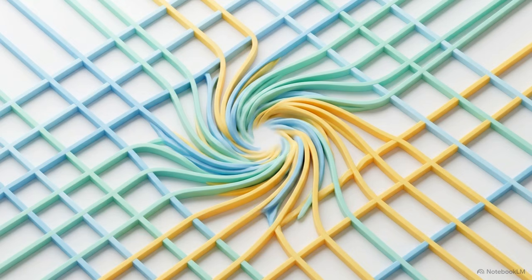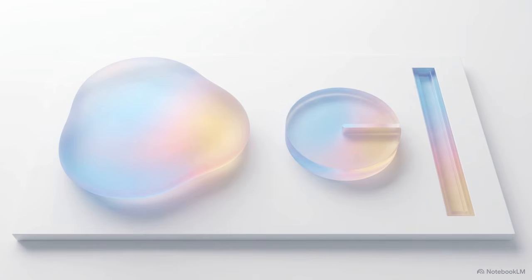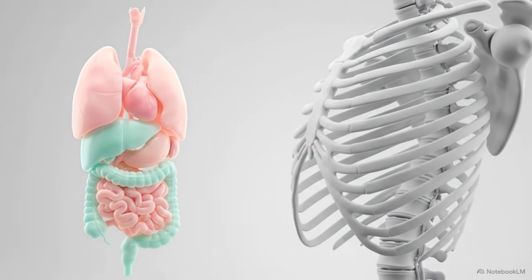Even if the physical hardware is intact, failures in the camera's underlying software correction matrix will warp the overall quantitative data across the entire field. And subtle, uncalibrated differences in individual detector sensitivity will introduce a mottled, uneven background noise to the scan. Unlike the organic shapes produced by biological sinks, hardware anomalies reveal themselves through strict, unnatural geometries, giving us perfect circles and hard, linear breaks.